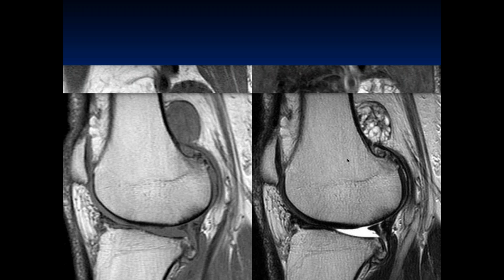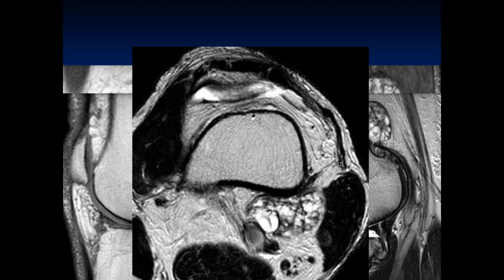There are several other lesions which can occur in this particular location. The most common thing here is just a benign ganglion cyst, probably because of an avulsion injury, chronic repetitive avulsion injury of the origin of the gastrocnemius tendon here, with then secondary ganglion cyst formation. In kids, you can get traction injuries in this location to the bone, which can be misinterpreted. And then occasionally you can have malignant lesions here, and we'll talk about those and how to differentiate those from the benign lesions when we get there.